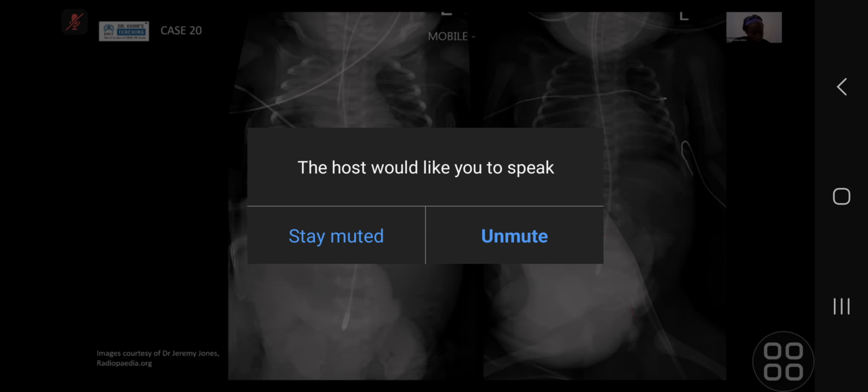Other than that, I think there's a sign of pneumoperitoneum, because I think there is a football sign in the abdomen. Okay. What makes you think there's a? Describe where you're seeing it for me. Because I think there's a lucency overlying the liver, as well as the left lumbar region. So somehow, I think it shows a football sign. Okay. Other findings.